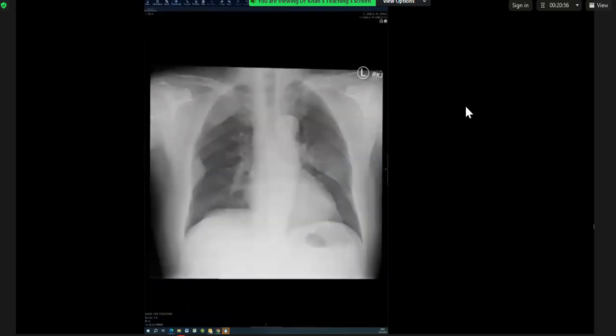Okay, have a go. I am presented with a frontal radiograph of the chest. There are bilateral opacities with large margins towards the pleura, particularly in the right upper and lower zone. They have obtuse margins with the pleural edge.